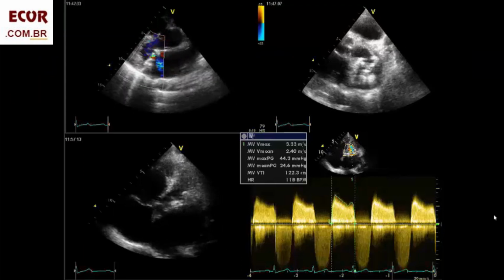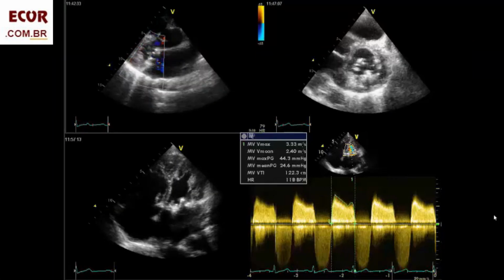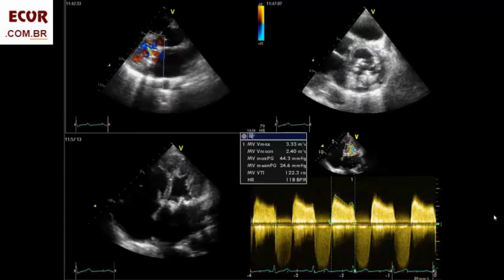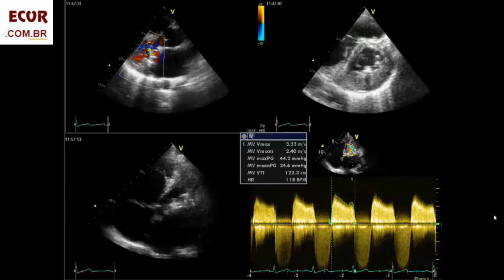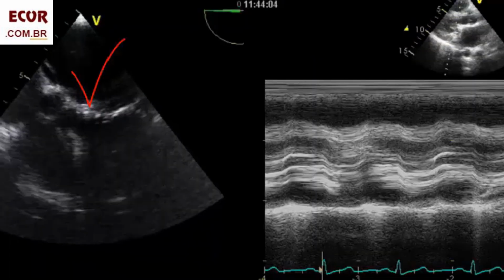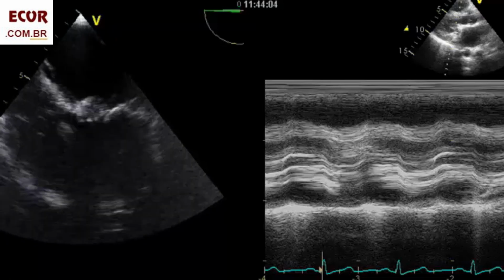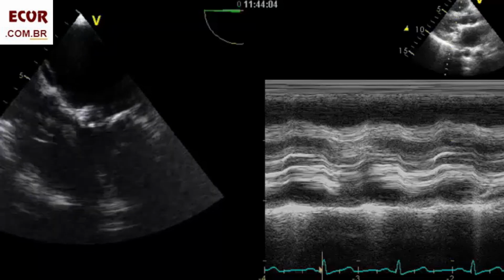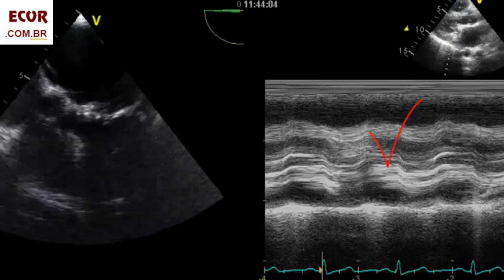Very similar case. Dense echoes between and involving also the struts. Important mean gradient, LA-LV, of 24.6 millimeters of mercury. TEE shows severe impairment of the whole prosthetic structure, characteristic M-mode aspect of calcification, with several lines with fine borders.